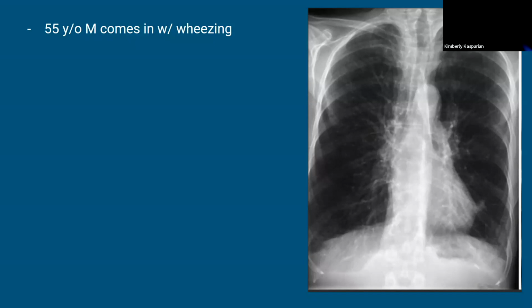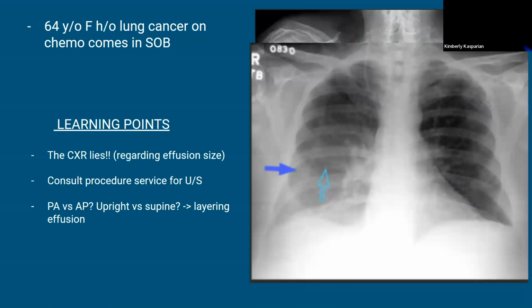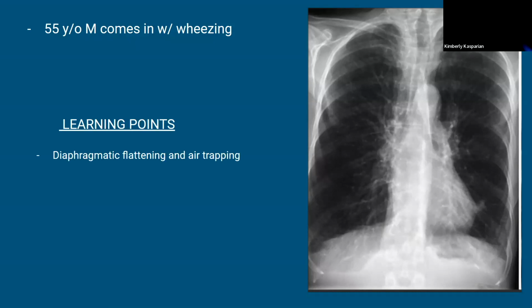Air is just totally black on a chest x-ray. So these people are just hyperinflated. Black lung, kind of even on both sides, barrel chested, long. You can even count ribs; that's probably down to rib 11 or so that it's expanded. A lot of times their diaphragms will be L-shaped, very flat, compared to our last guy, where you can see a very nice smooth hump versus flat. So that's really all I have on COPD chest x-rays. Diaphragm's flat, there's extra air in there.